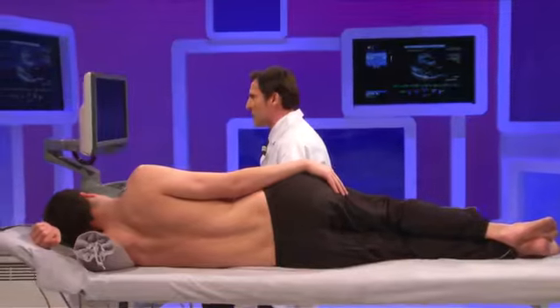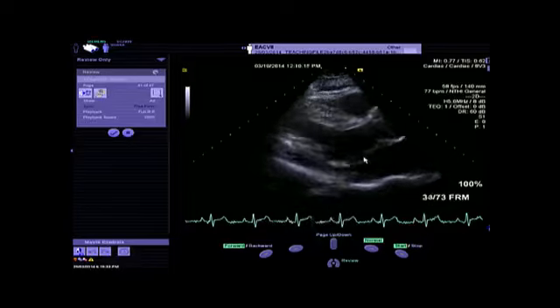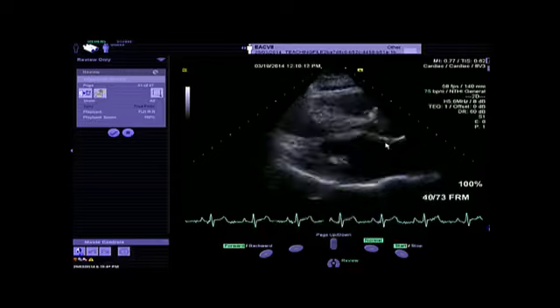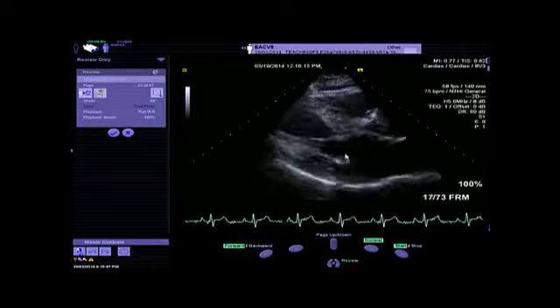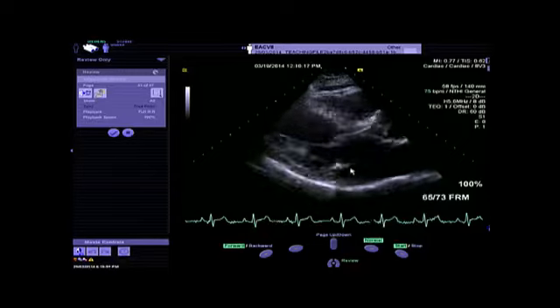So for sure, during the examination of the mitral valve morphology, you should also be able to determine the likelihood of mitral valve repair. And there are several criteria to be analyzed. So first, if there is some redundancy, if there are calcifications, and what scallops are involved in the disease process.